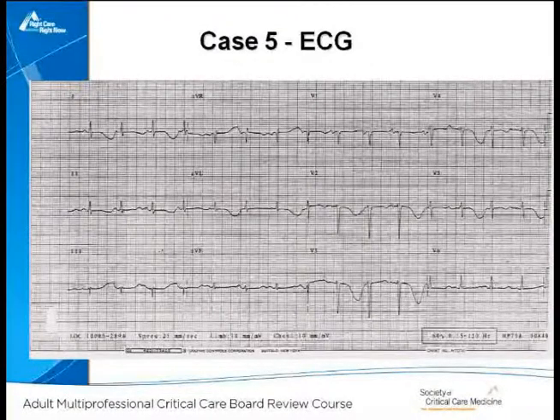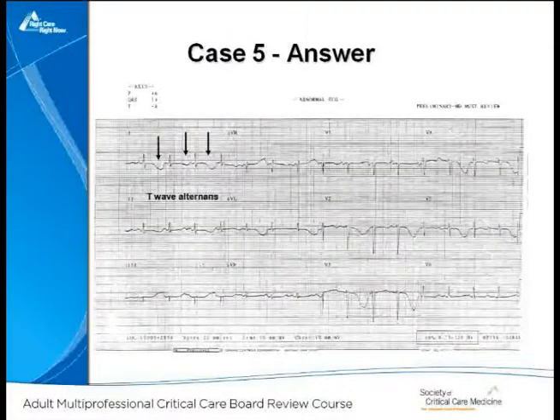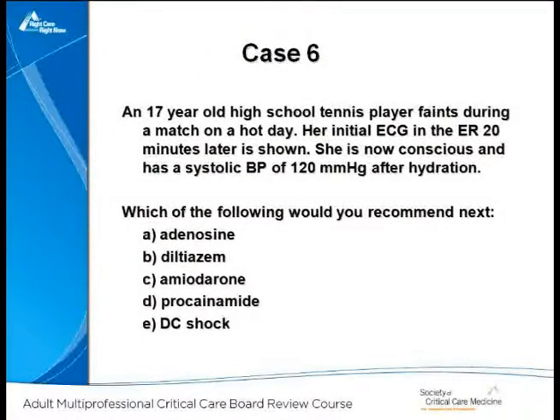Again, remember I said you can get the same cardiogram in two conditions. If this was a 17-year-old teenager with recurrent syncope who'd felt well and has 3 siblings who died in their sleep, you might think of QT prolongation, but the history is what tells you what this is likely to be, and that's what you'd recommend. Okay, so there's the T-wave alternans. You can see that. It's pretty dramatic. You can see it in multiple leads. Speeding this up, obviously she has a fast heart rate already, and that's in fact what's keeping her going, is that she doesn't slow down. If you slowed this person down, you might make things much, much worse.